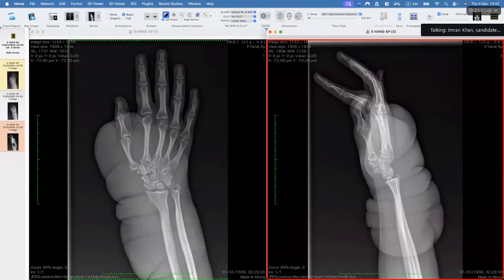You mean elephant leg? Yes. I didn't see it before in the hand. So when you say filariasis, I'm assuming you mean elephant leg. Okay. That's not what it is, but I'll buy that for now. We'll come to that. Any other differential? Also a lymphatic infiltration in a post-operative breast cancer patient. I don't remember the name.